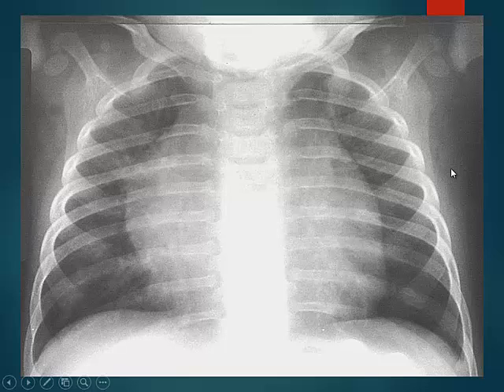Okay, so this is a normal X-ray of a neonate. It's normal because it's in a supine position, first of all, so there is a lot of magnification here of the heart, but also neonates and infants have a large thymus as well. So in a neonatal or infant age group, you can have a very wide looking heart and mediastinum, but it's normal.